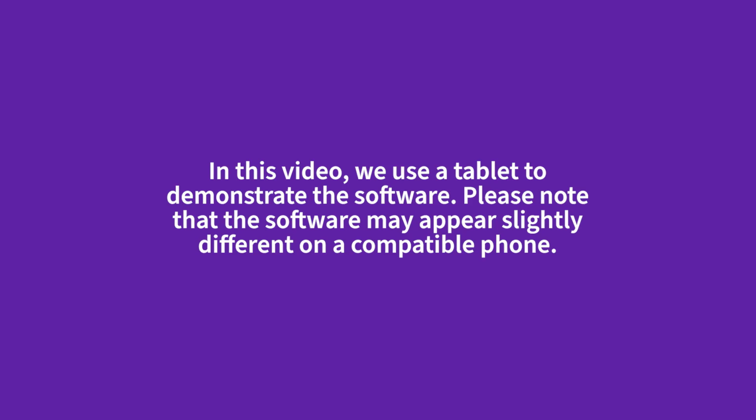In this video, we use a tablet to demonstrate the software, but a compatible phone may be used as well. We'll highlight the major differences on the phone throughout the video.